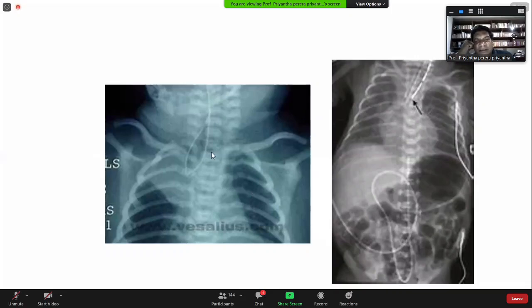You can have a tracheoesophageal fistula as well. That means the upper part of the esophagus is blindly ending, and the lower part may or may not be connecting with the respiratory tract. Sometimes it can be only esophageal atresia without a fistula, or esophageal atresia with a fistula. In this one, what do you think? Is it esophageal atresia plus fistula or no fistula?